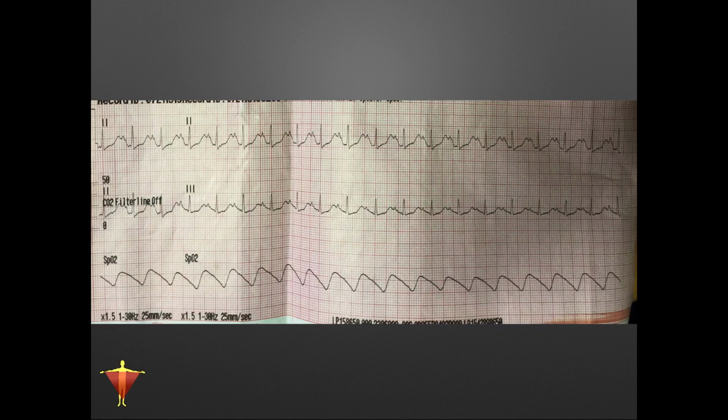So if I were to use, let's say the box method or the R to R, I'm going to move down to this middle strip right here, and I'm going to come right here because this one lands right on a line. So if I go to one line, that's going to be 300. I go to my next box, that'd be 150, right? If I went to my next box, that would be 100. So it's somewhere between 100 and 150.